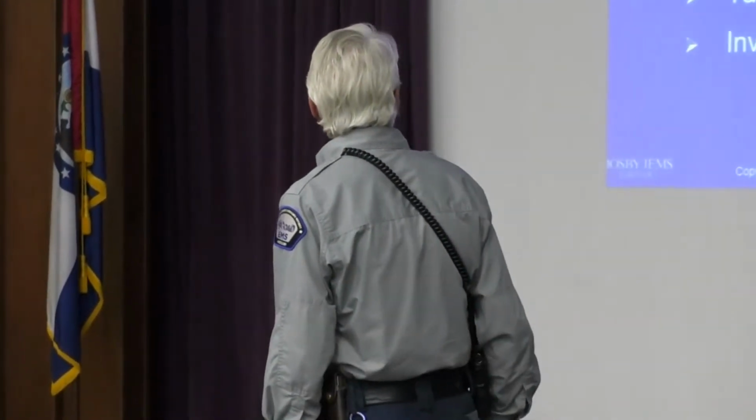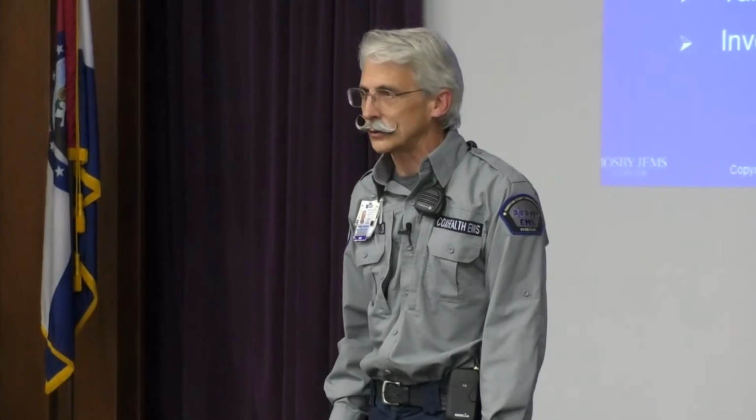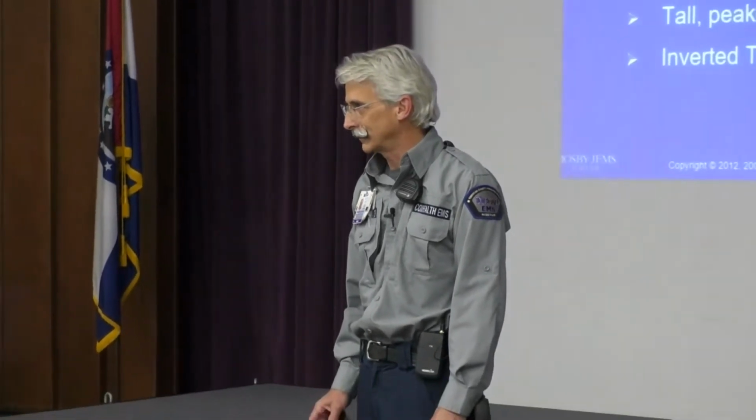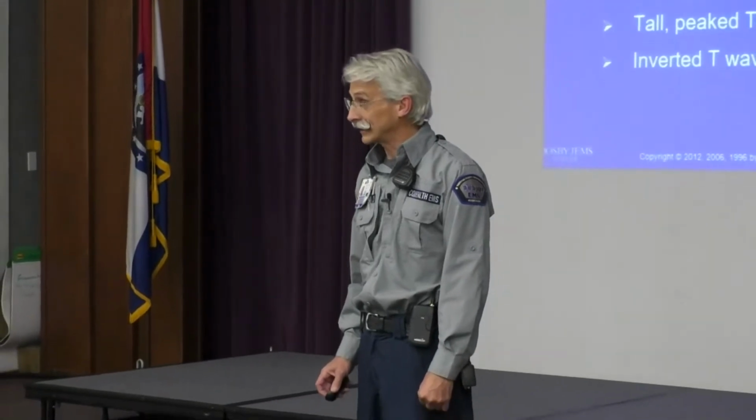Okay, so identify rate and rhythm. Fix it if you need to so they don't die while we're doing the rest of this. Okay? Seriously.